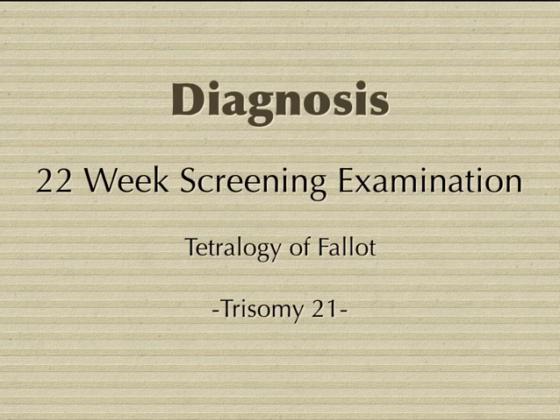The final diagnosis was tetralogy of Fallot. The fetus had trisomy 21.